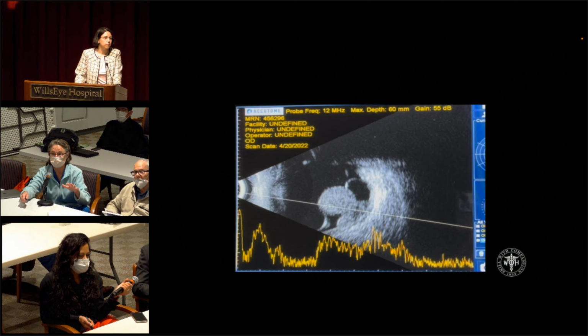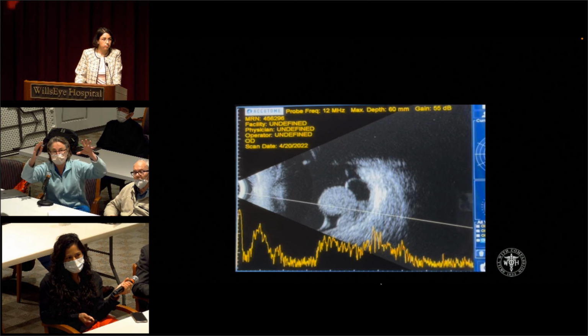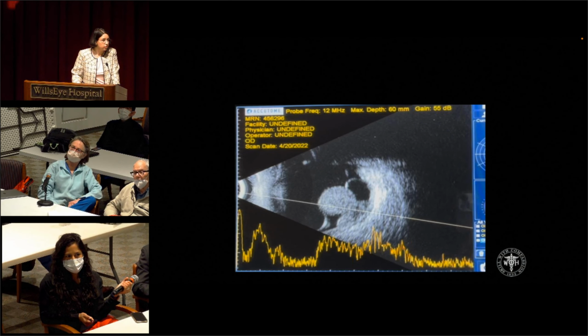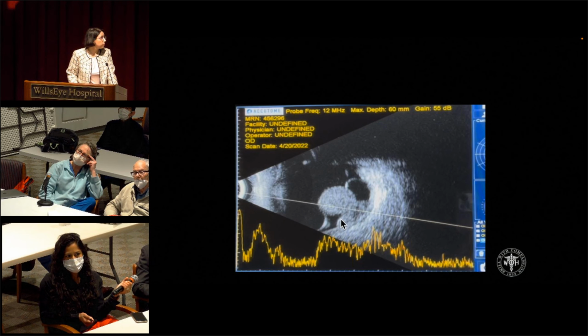And the reason the apex looks so dense is because those vessels are strangulated by Bruch's membrane and they're all dilated, whereas the base is all compressed. So you get good sound transmission and it looks more hollow. And again, this is Bruch's membrane right here. And that's what gives you the strangulation pattern.